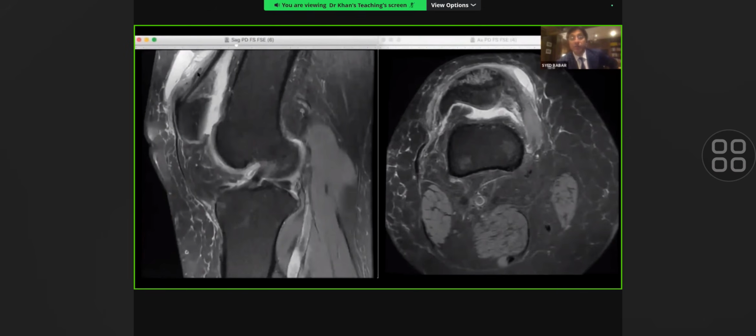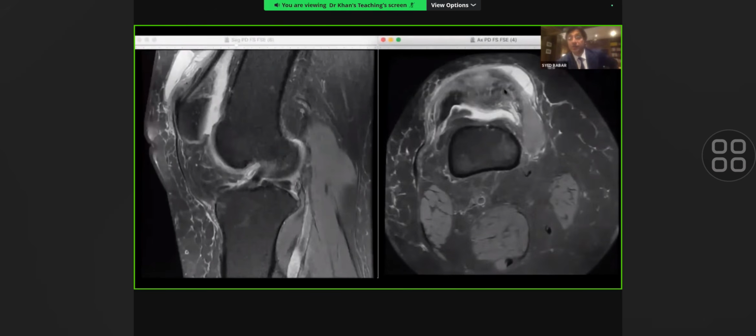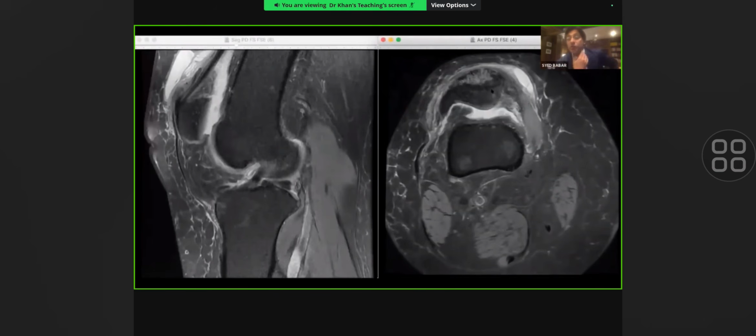Now, if there is a central fiber which is still intact, you may have actually disrupted the tendon on either side, but the central tendon is still holding the quadriceps at the superior pole of the patella. So they may just treat them conservatively. Remember, this is a middle-aged man. If he was a footballer, they'd probably go in and repair it.